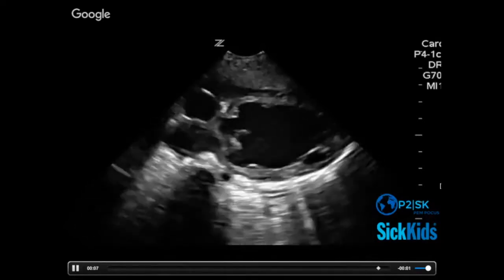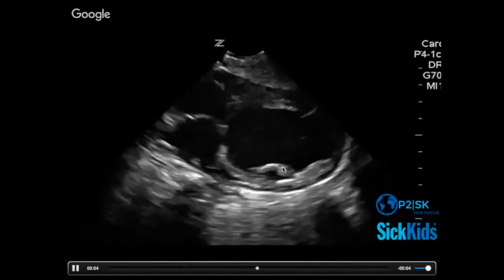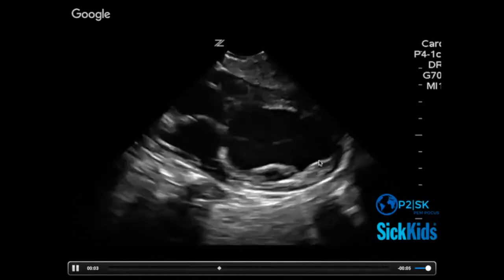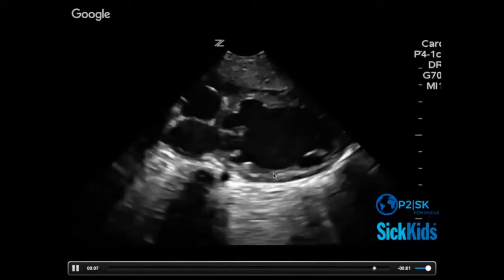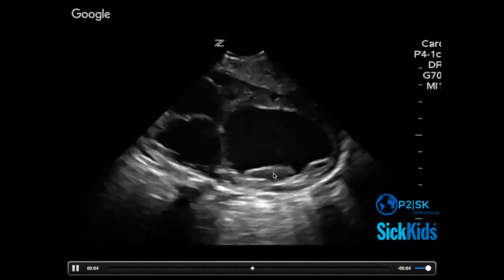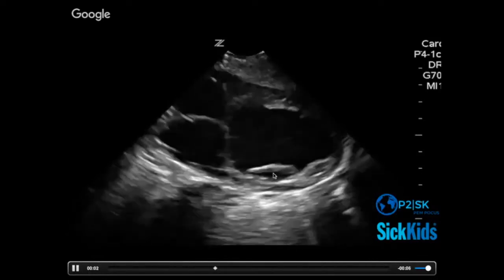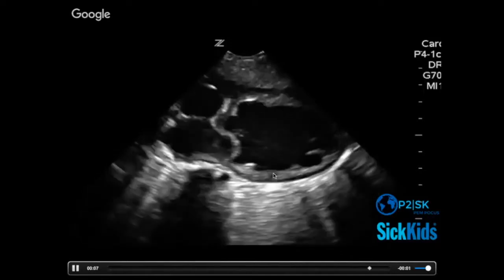What's the shadows inside? Hyperechoic stuff. I don't know for sure. I mean, it's endocardium of some kind. So is it looking like that because it's papillary muscles that just aren't where they normally are supposed to be? I don't know. I know it was a kid with a previously structurally normal heart who had viral myocarditis.